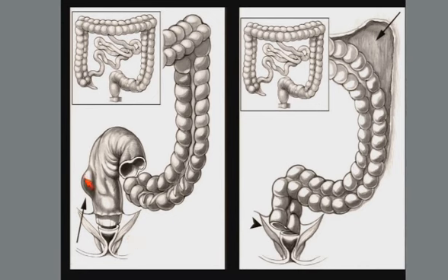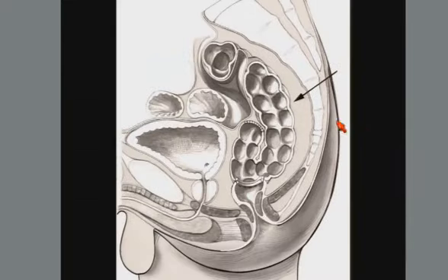There are a couple things you have to remember. Again, this is a low anterior resection. The tumor is above the sphincter complex. The levator ani are showing where the sphincter complex is. So this portion of the colon is going to be resected. In doing so, the patient is going to have the splenic flexure freed up. If you're going to have a direct coloanal anastomosis, you need a bit of that length to be able to make that anastomosis. So not only will you see post-surgical changes here, but you'll see post-surgical changes in the left upper quadrant possibly.